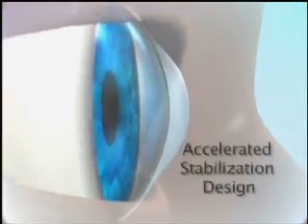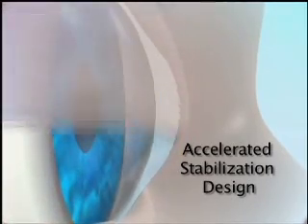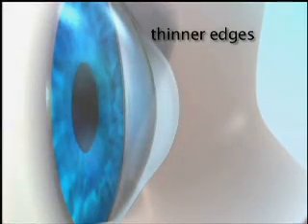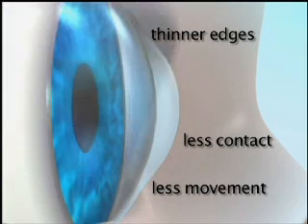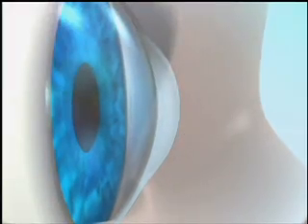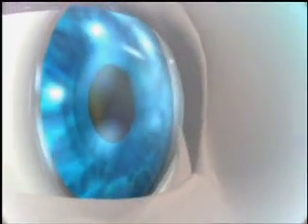With accelerated stabilisation design, the lens is much thinner under each of the eyelids. This means there's less interaction before, during, and after a blink. Because there's less interaction, you get less torsional or twisting movement with this lens. That's not the only advantage of this type of design.